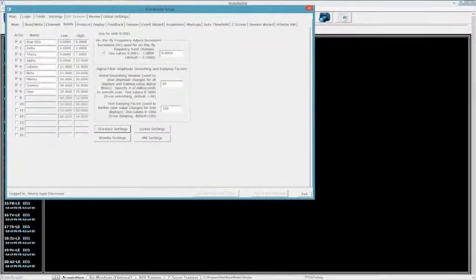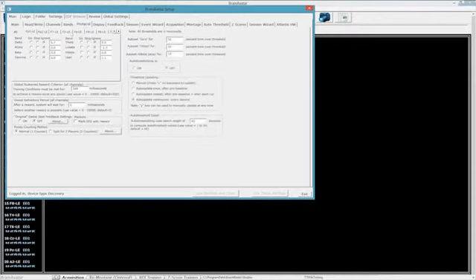The initial software of the BrainMaster software was basically right here, this bands page and this protocol page. Basically what we said is you're going to a specific site. For example, this one right here is FP1 to LE. And you can either stop inhibit training, you can go reward training, or you can ignore, do nothing. And that's how the software was built.